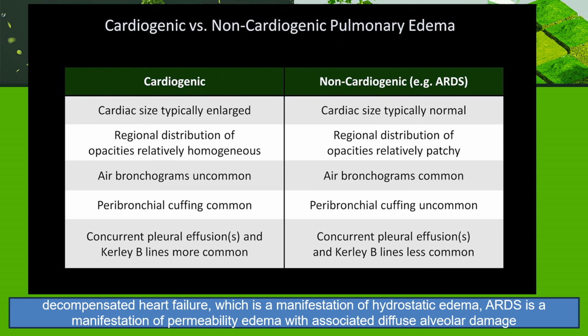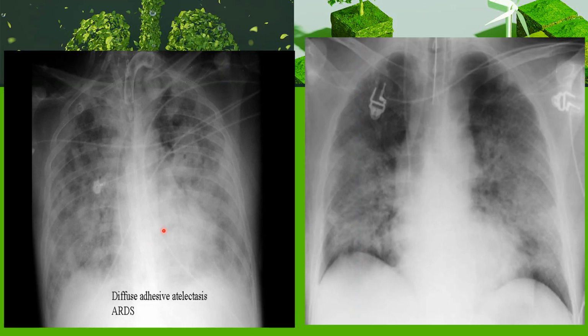We will see some X-rays of cardiogenic and non-cardiogenic pulmonary edema.